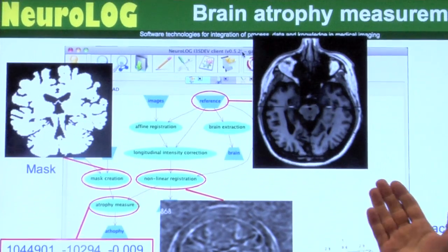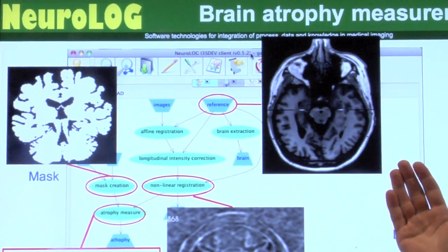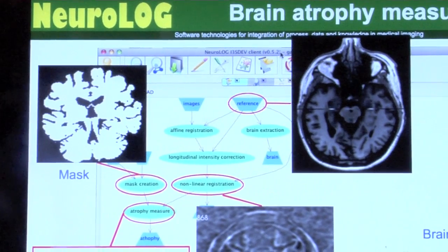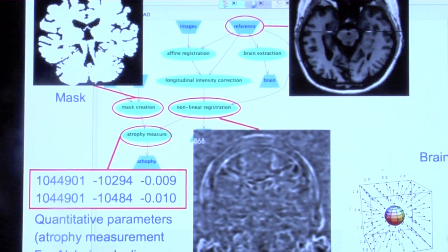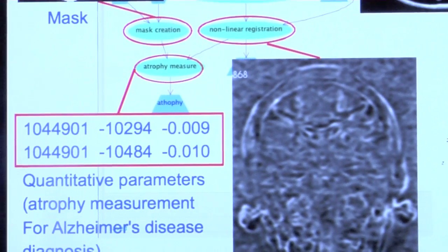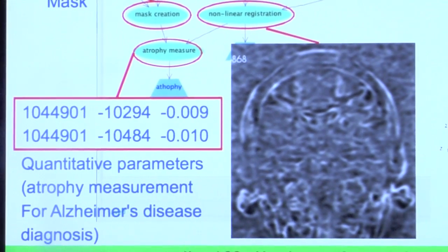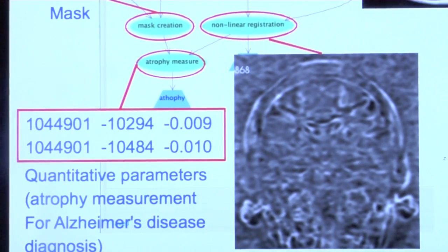you can see here, starting from an image of the brain of some patient, making some computation like tissues extraction, computation of the deformation field inside the brain that is related to some neurodegenerative disease the patient is affected with, like the Alzheimer's disease, and quantification of this deformation through parameters that the clinician can interpret.